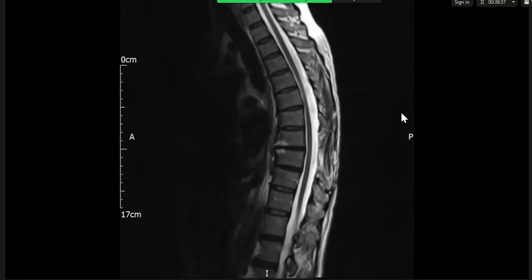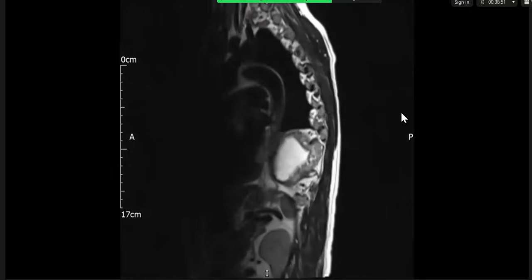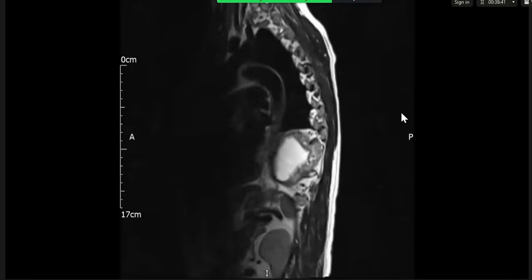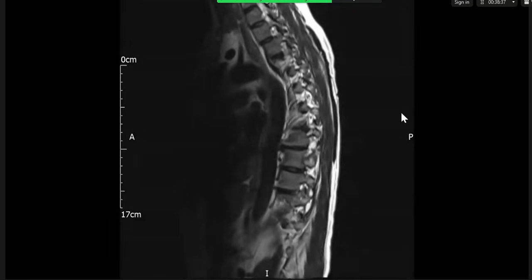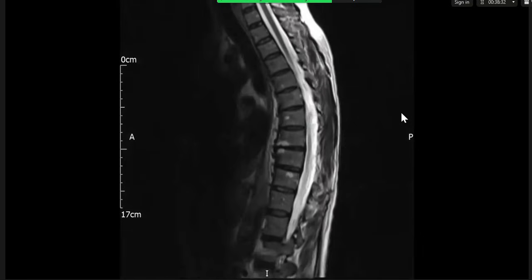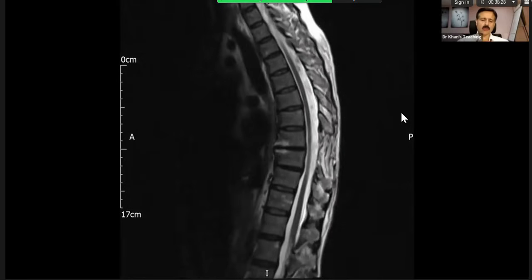And what we've got here, this is a T2 weighted sagittal sequence. I'm focusing on that same lesion. The bulk of the lesion is T2 hyperintense with a thick lower intensity wall with some heterogeneity within it. And then again, it seems to emanate specifically from the pedicle of the adjacent vertebra. Right. You have more series, just go through them.